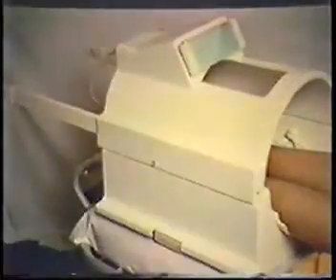This is just a patient who had pain around the wrist, was thought to be kind of a semi-crock. We imaged him and had some problems with tech, but we could see a large area of abnormality here. And one thing, if you do a lot of joints that have very, very complicated anatomy in them, the first thing that I like to do is go through to see if I see any areas of high signal intensity on the second echo image that's not on the first echo image. When you see this, that's something that's bad, and you go from there. And that's actually been fairly helpful.